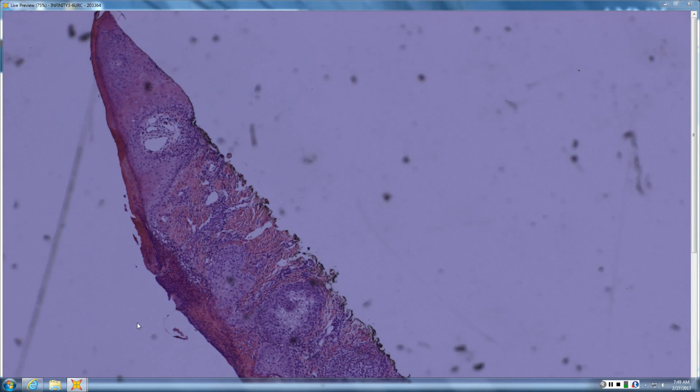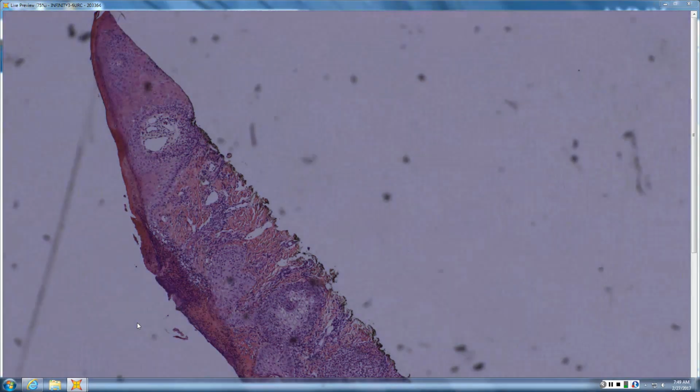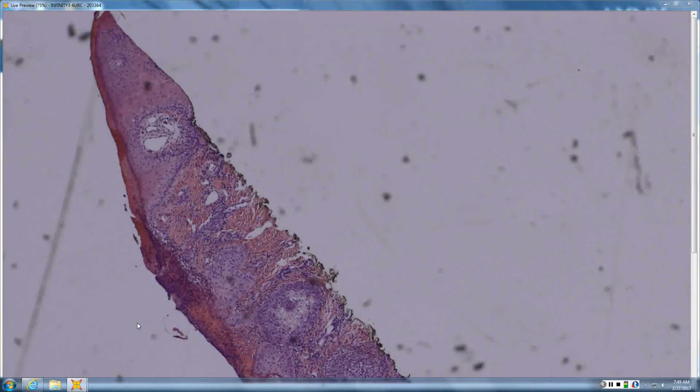Is that changing the light for you guys? Yeah, okay, it's fine. Just seems a little dim. I'll figure it out after. Oh, you know what? Neutral density filter. That's what. There you go. Look at that. Okay. Now are we burning retinas? Tell me when we're comfortable. Good there? Okay. So if that ever happens, the neutral density filters are down here. Someone just bumped it or moved the keyboard and knocked it.